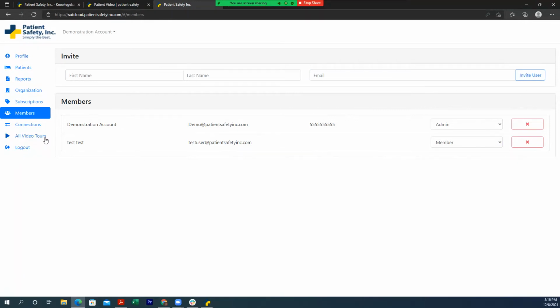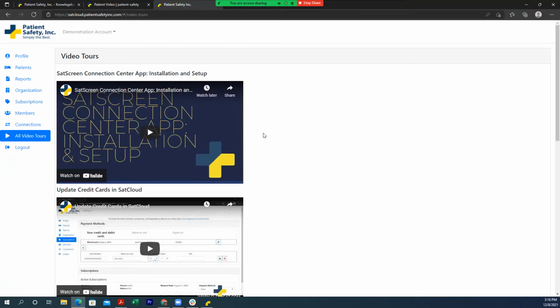And lastly, I want to highlight how we have a video tour of the web portal in the web portal. So if you have any questions about how to use this section of our offering, please visit the video tour area. More than likely your question is answered there. But that is it for the SatCloud web portal section.